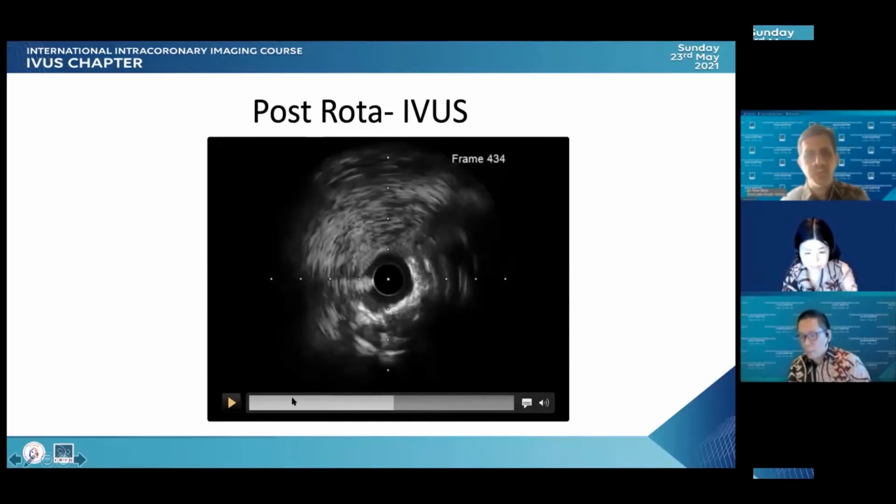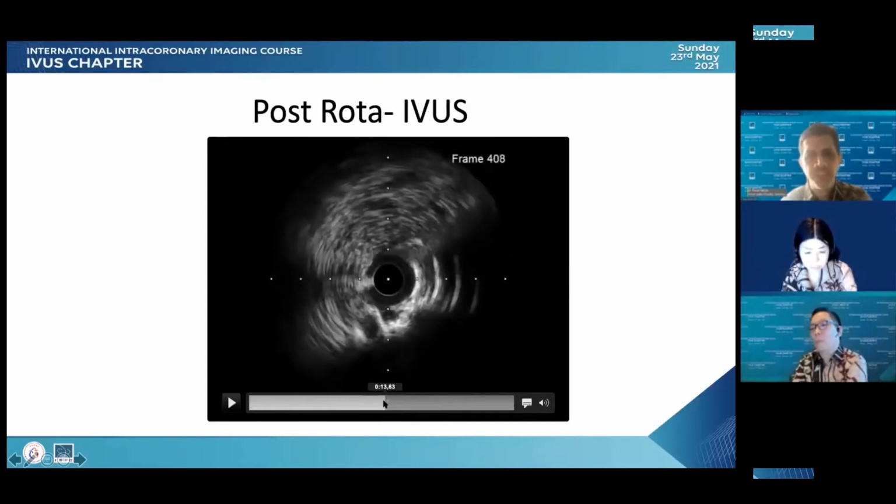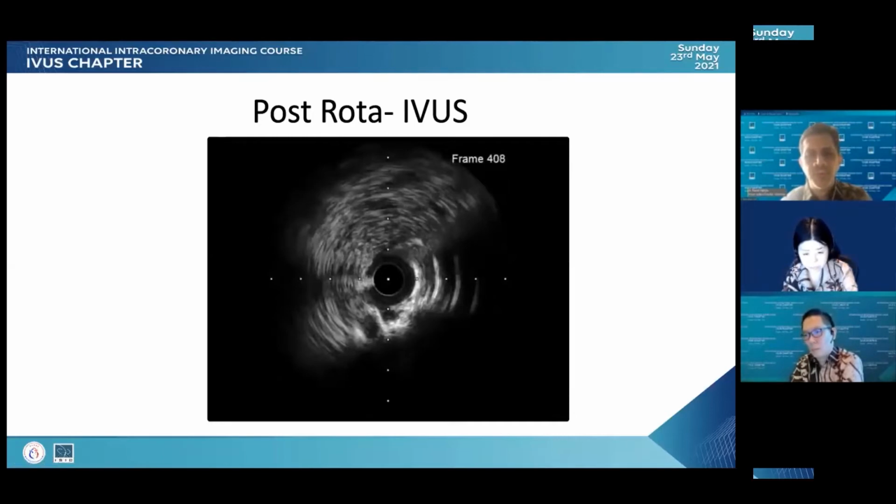At 3 o'clock, you see the nice concave shape. And then behind, you see a double layer or even one more layer. So that's really reverberation. And when you see the reverberation after the rotor, that indicates that you polished the surface well, because after polishing the surface, ultrasound can reflect much more than without. And then we start seeing this type of reverberation.